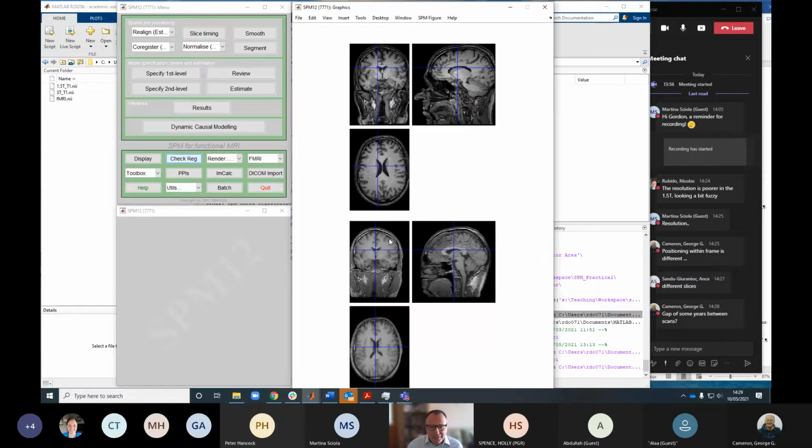As you can see, not only are my ventricles bigger here, but you can also see that the gaps in the sulci are slightly bigger than they are over here, down at the bottom in the 1.5 T scan. But I'm not worried about it because everybody's brain shrinks as we get older. It's just part of aging. But what this is a demonstration of is one of the things that you can use SPM for: you can use it to measure how much shrinkage someone's brain has.